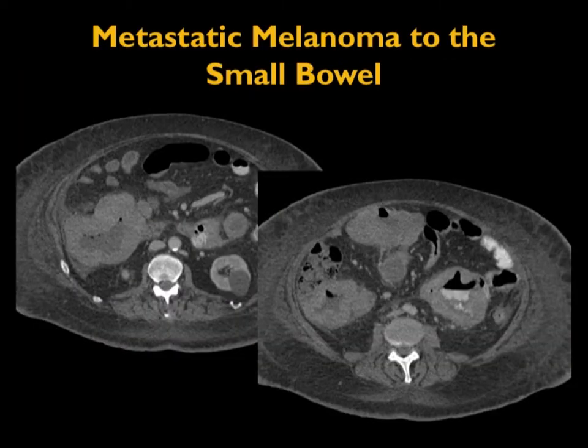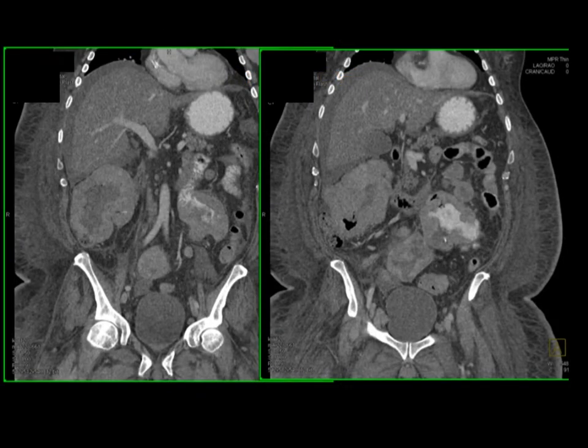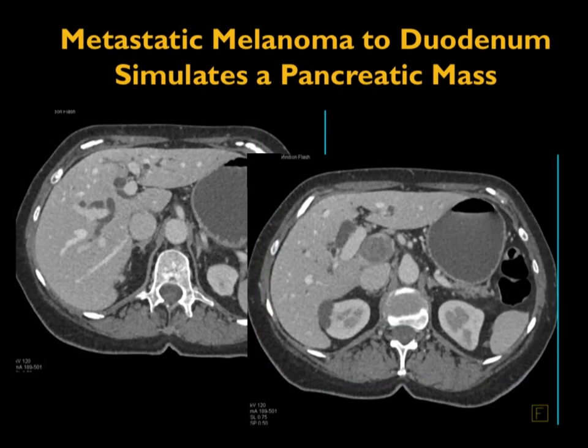We talk about melanoma, multiple large ulcerating masses. Here's one example with a large mass in the right lower quadrant ulcerating. There's another mass on the left side. If this was lymphoma, exoendophytic lymphoma, sure. But when you start seeing multiple masses, we always think about melanoma, though it doesn't have to be melanoma. We think about metastasis in general. This was melanoma.